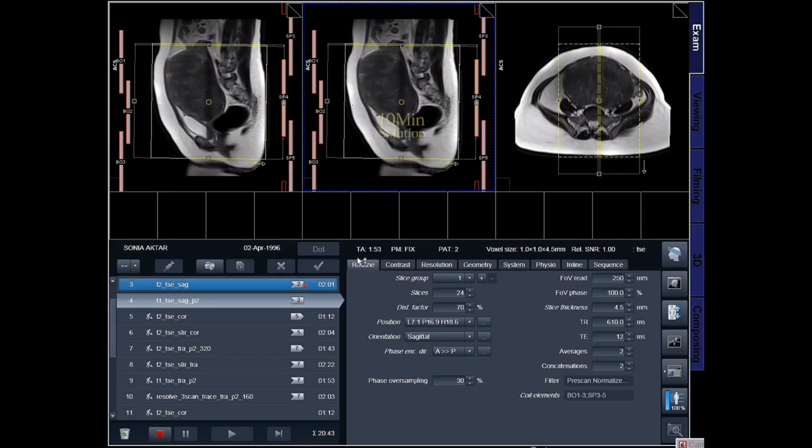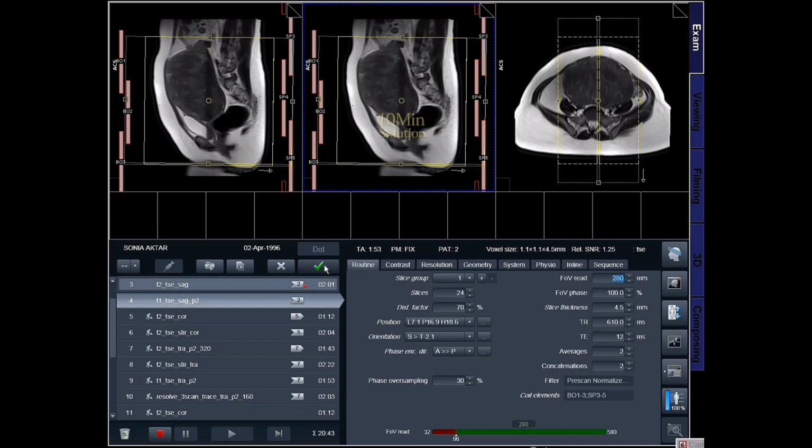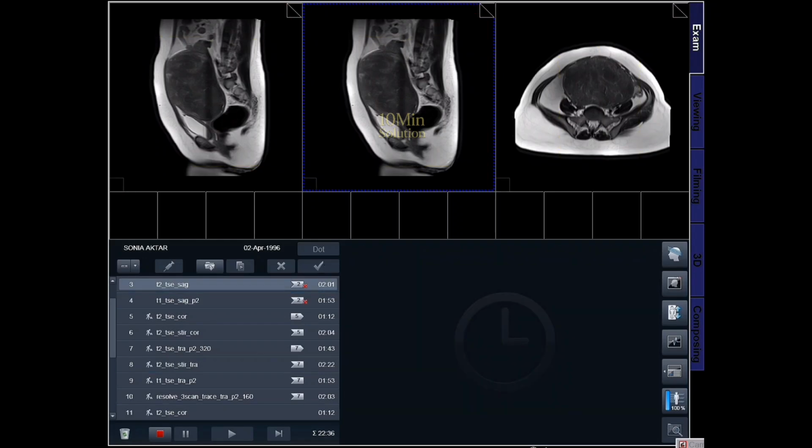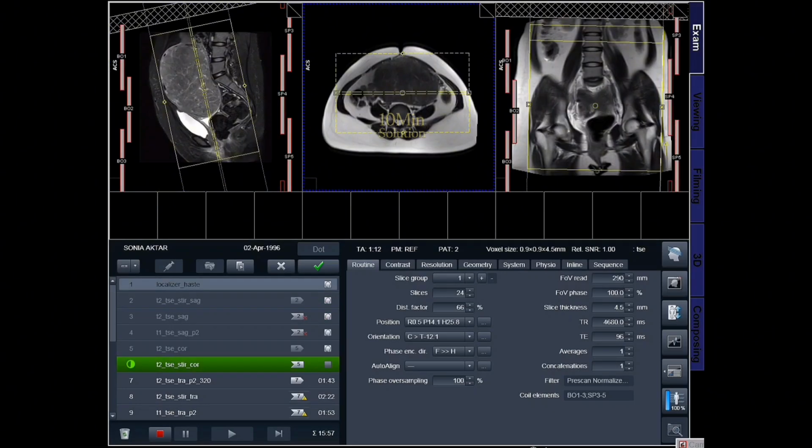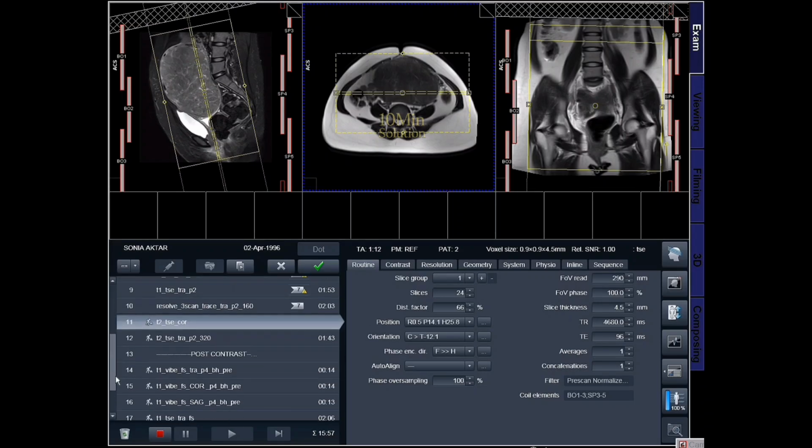Now the next plan, T2 coronal. The coronal plan will be on the sagittal and axial images, and look at the final image. This is the STIR sagittal image, and look at the big pathology. Right now look here. Now I nicely set up the planning.